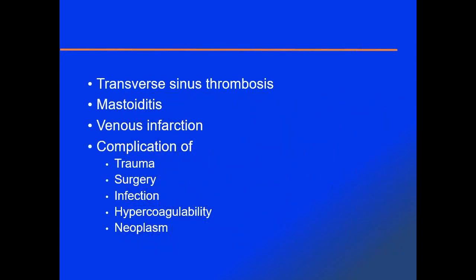So this is a case of a transverse sinus thrombosis. In fact, it's more than transverse sinus. It's transverse sinus and sigmoid sinus thrombosis due to mastoiditis, and the venous sinus thrombosis led to venous infarction, and such findings can be seen as complications of not only infections, but trauma or surgery or neoplasm.